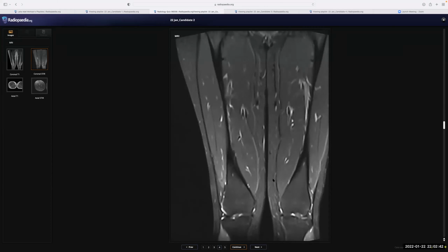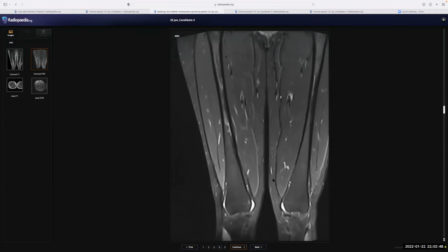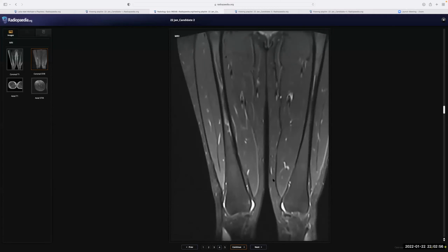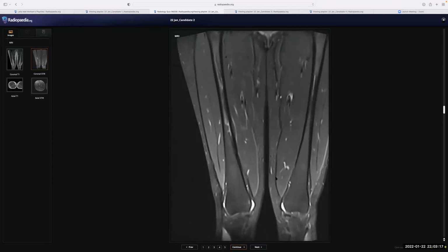I would ask the clinician if there is any history of previous hematological diseases, including sickle cell disease or thalassemia, or is there any risk factor for microischemic injury? One of the differentials could be that this patient has sickle cell or thalassemia, and in that case, I should have looked more closely at the vertebral bodies when I was looking at the hip X-ray. Okay, she doesn't have sickle cell, but she is a military person. Okay.